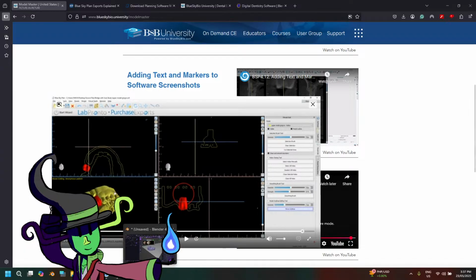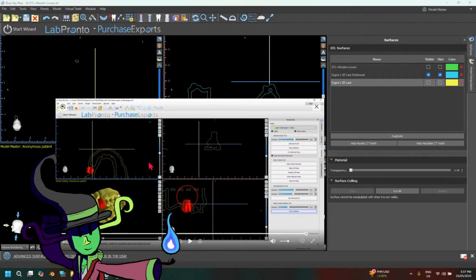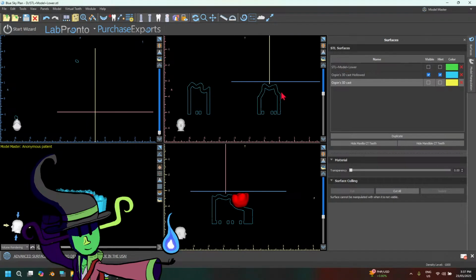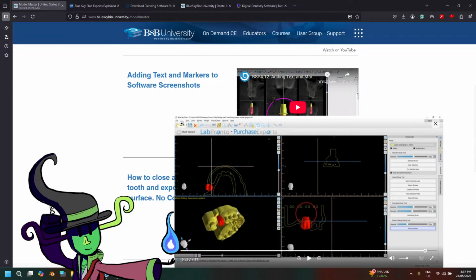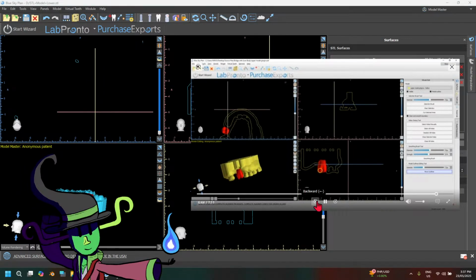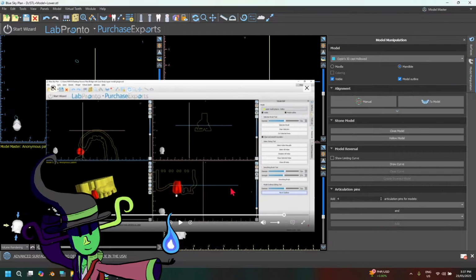Oh, wait a minute. Hold on. Wait, what did he do? What did you do again? You can sculpt here. Grab into these circles, we can move outlines. We hold down the shift key, our cursor turns into these circles, we can change these. In our model edit, select the model, and click move outlines. Ooh, wait. Move outlines? Wait, where is it?